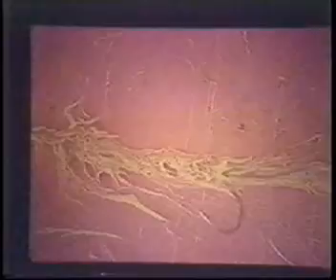Now this is a situation of a grade 3 tear that we did in a cadaver. And notice how it's a little bit tenuous in its communication with the inferior surface. We disarticulated this knee, removed the meniscus in whole, and it looked entirely normal. We then sectioned the meniscus and did H&E staining, and right in the location where we see the abnormal signal here, there was a frank fibrocartilaginous separation, which was a tear, and this is the intrasubstance tear within the meniscus, which was initially described by Smiley back in the 60s as the earliest stage of the clinically significant horizontal cleavage tear.